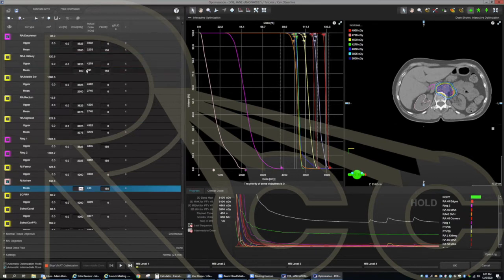This one's 1 gray high. So they're all doing pretty well. If they start being like 1.5 gray difference, I probably won't be able to push much more. Other than that, it's sort of a visualization. You don't want it to change too much from your original, but you'll allow it to change a little bit.